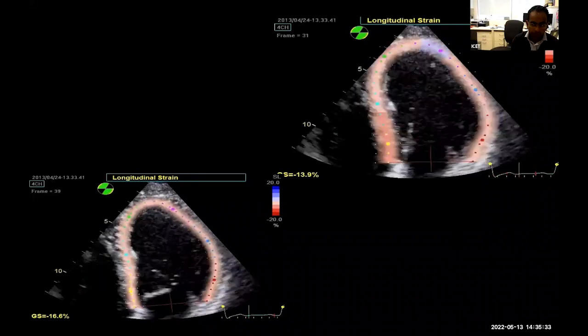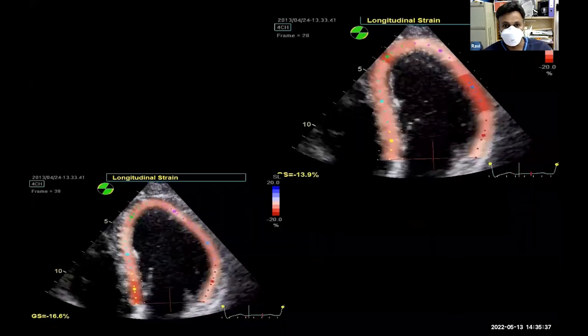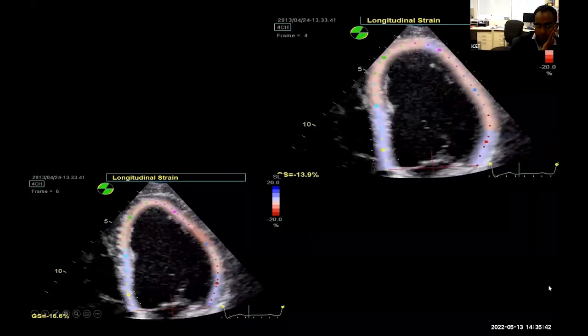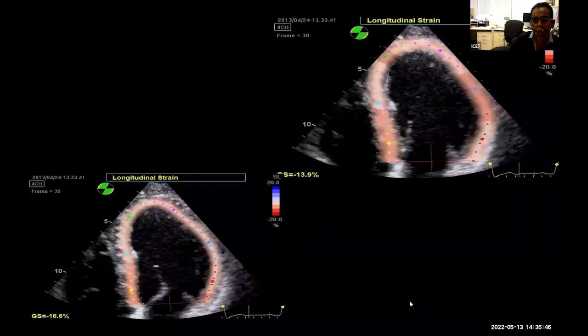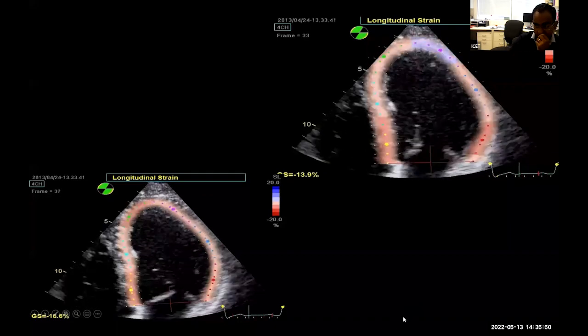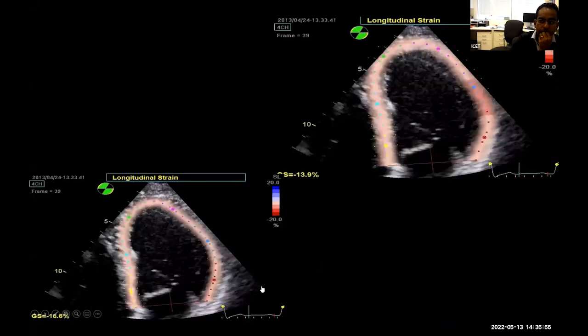Yeah, it's difficult to interpret that part of the information. That's good. I agree with you, Ravi. You said something about region of interest. Yeah, it's narrower in the left lower corner image. I don't know which one's the better one. Maybe the one with the bigger region of interest will be more.